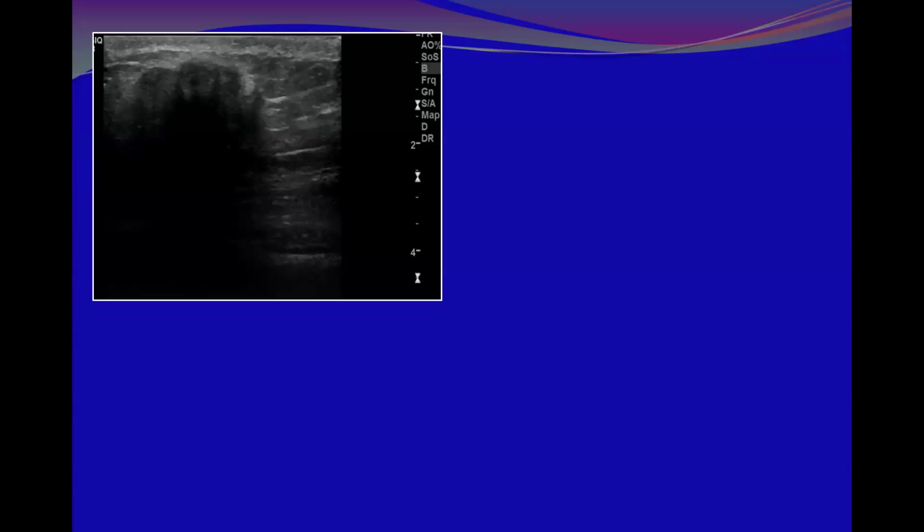Okay. If I look at this one, there is extensive shadowing, but there is a clue that this mass is most likely malignant. Why? Because of the rim as well as the overlying skin thickening. This is not a capsule.